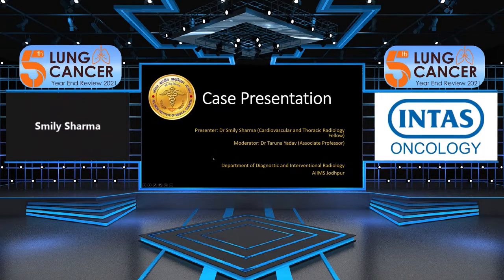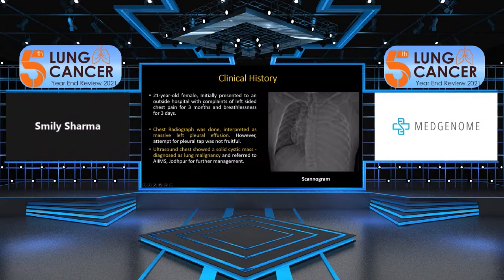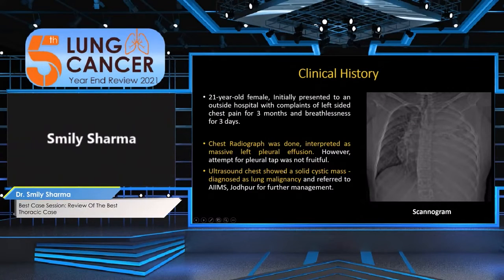I'm Dr. Smily Sharma and I'm going to present a case of a 21-year-old female who initially presented to an outside hospital with complaints of left-sided chest pain for 3 months and breathlessness for 3 days. Her chest radiograph was interpreted as massive left pleural effusion. However, the attempt for pleural tap was not fruitful. Ultrasound chest showed a solid cystic mass and she was diagnosed to have lung malignancy and was referred to AIIMS Jodhpur for further management.